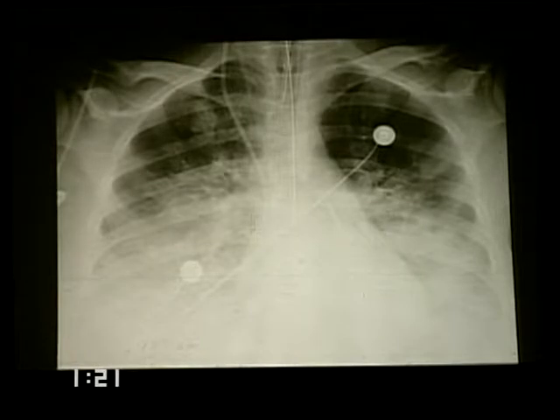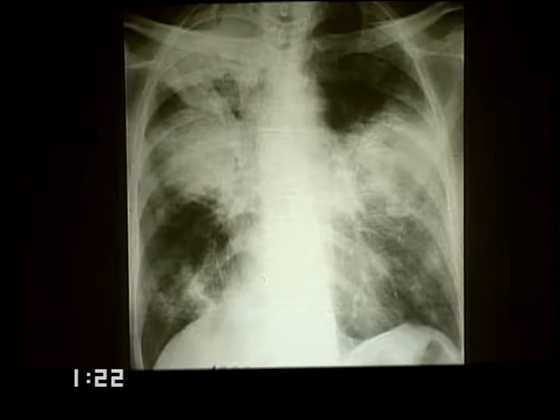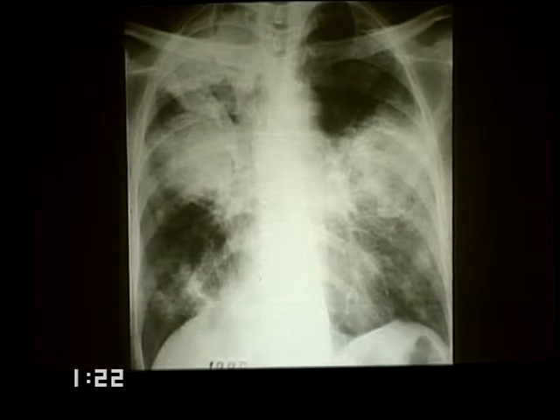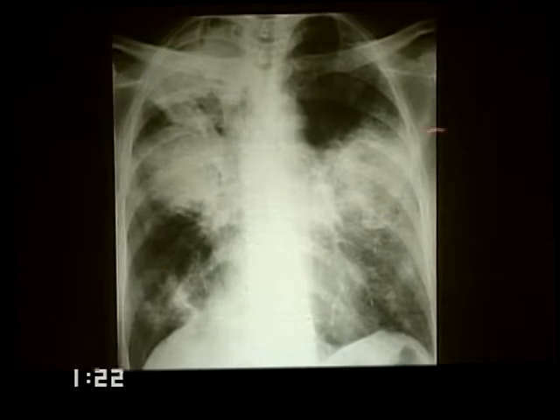as an opportunistic infection. It is very uncommon for community-acquired pneumococcal pneumonia to lead to death unless there is an underlying risk factor, and the risk factors you must ask about are the usual ones, AIDS, etc. Don't forget alcohol. Alcohol is a very common cause of pneumococcal or other community-acquired pneumonias. Patchy airspace disease, completely non-specific.